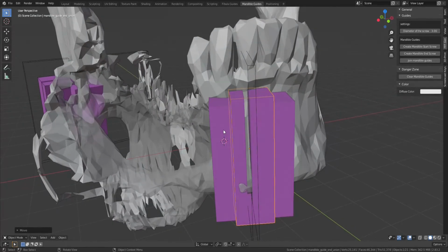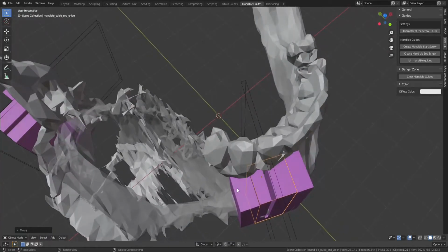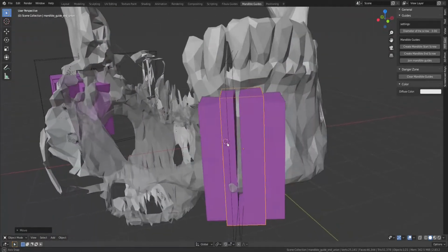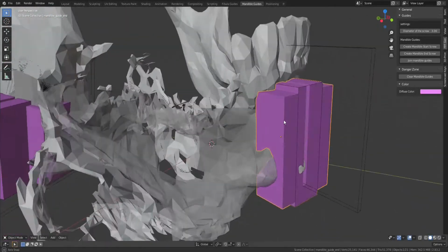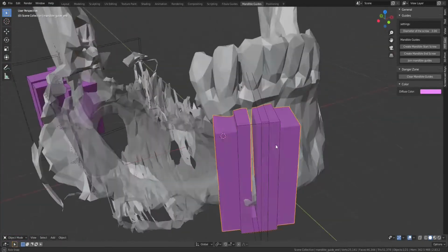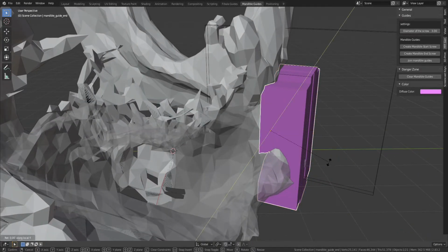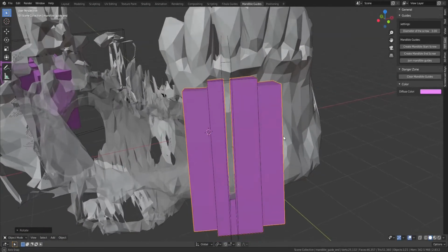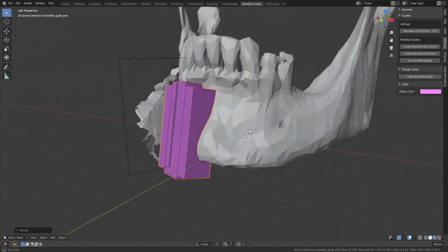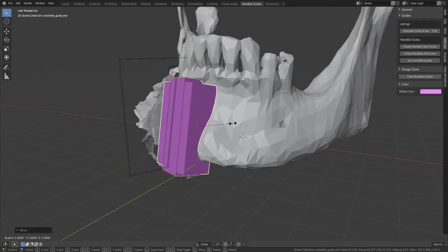There is too little space for the screw because the tumor tissue is somewhere here. So I'm afraid that I will have to put it somewhere here, but not sure. We will have to see. Okay, rotate. Let's rotate like that. Yes, and grab and move it a little bit. Now grab that. Okay, scale.